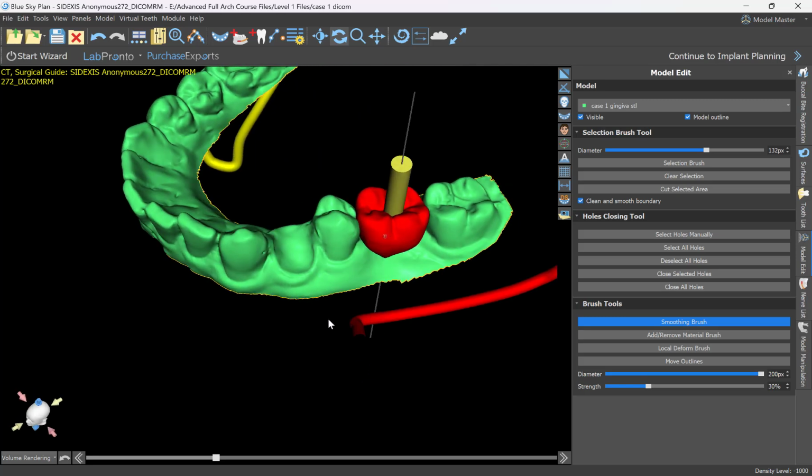So you've got either option. You could just simply cut it and that will work. Close your model if you just want to do it quick and dirty. If you're trying to have really fine control, you can do it this way.